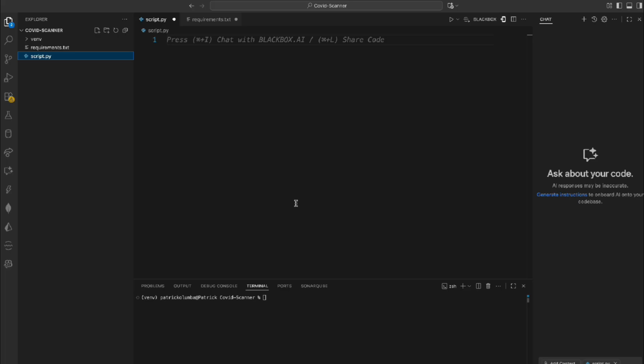libraries that we need, the next thing we want to do is to structure our project the right way. So I actually have the script. This is where we're going to be training a model. And the next thing we want to look at is the data set. I'm just going to go ahead here and create a folder. And I'm going to call this folder dataset, because this is where we're going to be putting all of the images for testing as well as training data sets.